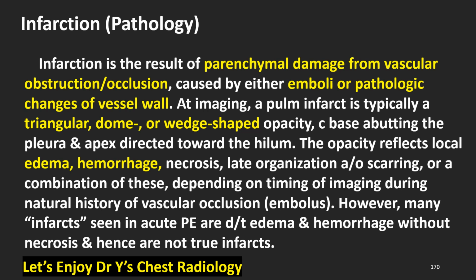However, many infarcts seen in acute pulmonary embolism are due to edema and hemorrhage without necrosis and hence are not true infarcts.